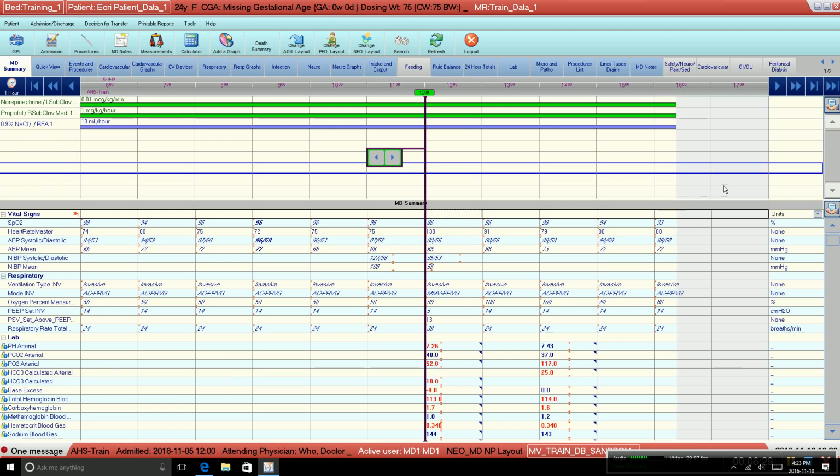The last part of this row, though, is the time moving the columns. There are 3 buttons on the left-hand side and 4 buttons on the right-hand side, and if you just tab over them, you'll see that they actually describe what they do.